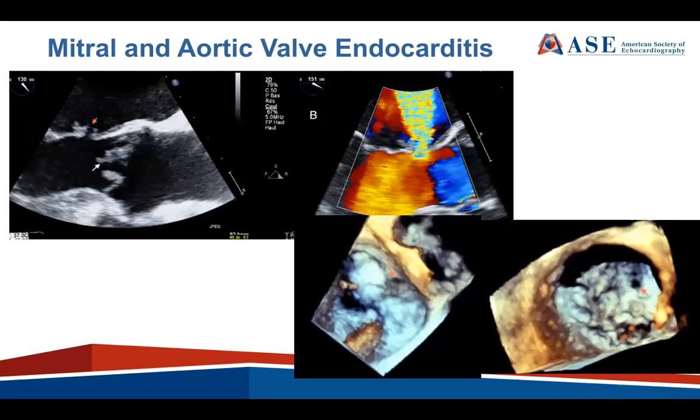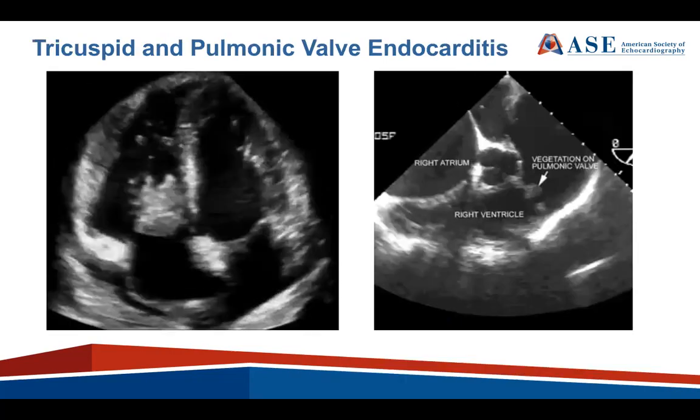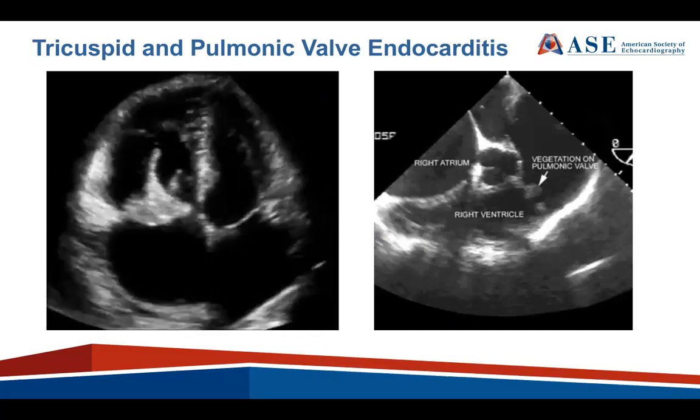These are still pictures. The mitral aortic infective endocarditis is seen here. So this is a patient with aortic valve endocarditis that's probably extended to the mitral valve, and it's caused perforation of that mitral valve, resulting in severe mitral regurgitation as well. And you can see the three-dimensional image right here with the red arrows depicting the perforation of the anterior mitral valve leaflet.